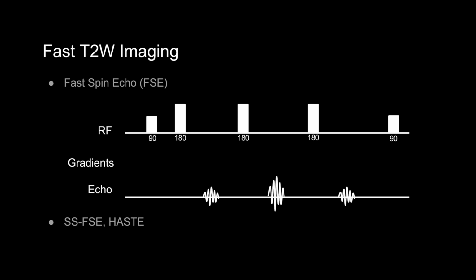You can also have conventional fast spin echo images that can have better contrast and resolution if motion artifacts can be reduced. So a lot of protocols will also include a traditional fast spin echo. There are also certain artifacts that can be avoided, but that's, again, beyond the scope of this introductory talk. On these T2 weighted fast spin echo sequences, remember, fat is going to look bright, and that has to do with the multiple 180-degree pulses. The mechanism is beyond this talk.